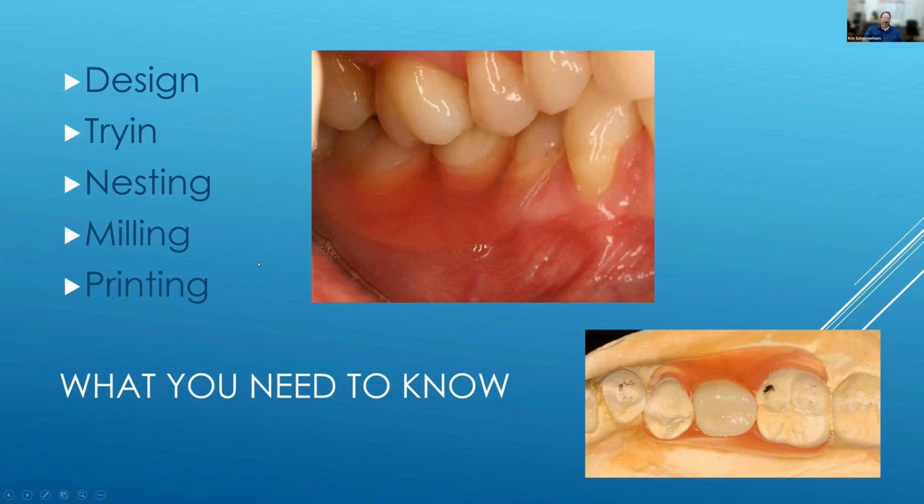I'm going to show Millbox as well as Hyperdent, because those seem to be the two most popular, and I'll show you what we do in each one of those CAM softwares. And then the milling, I'll talk a little bit about the offsets and the size tooling to be used, and how we've worked with Millbox as well as Hyperdent to come up with milling strategies to be efficient at milling these materials, because that's a biggie. Big drawback in the past was taking 2 or 3 hours to mill an appliance. Now we've gotten it down to about an hour in most of the newer mills.